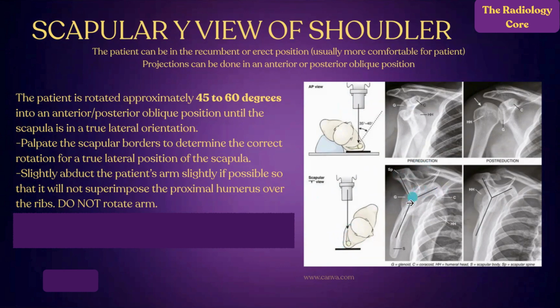So this here. Like in this case, see how you can see the coracoid is here and the acromion is back here. So if you see the humeral head sitting more inferior, then this would be an example of an anterior dislocation. And then this looks like post-reduction.